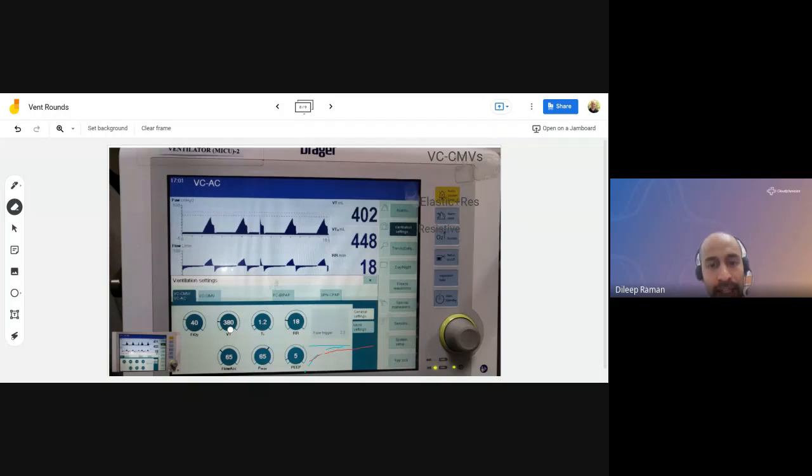The amazing fact here is that even though they are calling it wholeheartedly VC, it is a simulation. What you're seeing is a simulation. The actual mode is PC. Because if this was true flow control, you would see exactly what you should see as flow control.